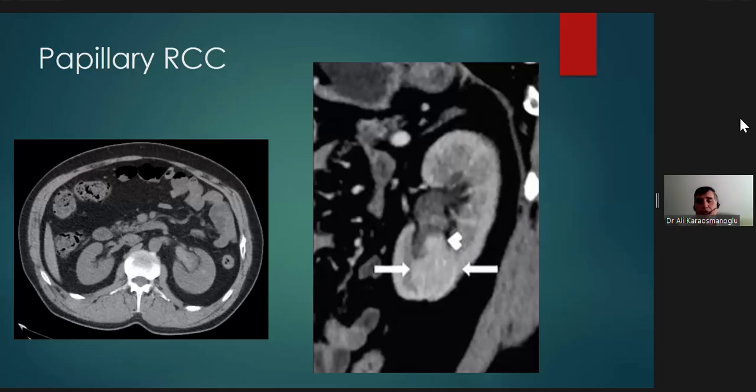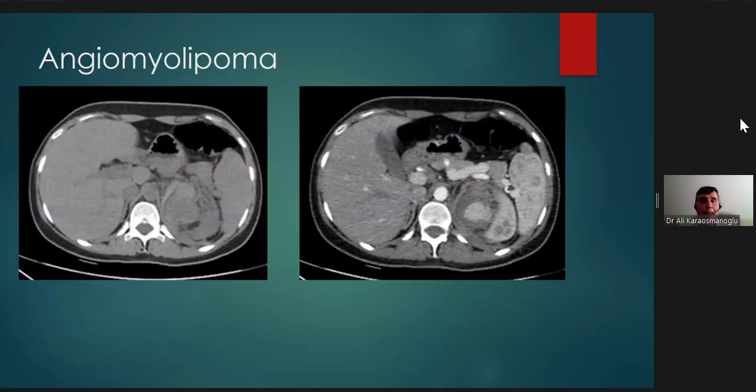The surgeon resected this tumor, which turned out to be a papillary RCC. Obviously, urinary bladder tumors and enlarged prostate gland are the most common etiologies of gross hematuria, but we should always consider renal tumors or renal causes in patients with hematuria as well.